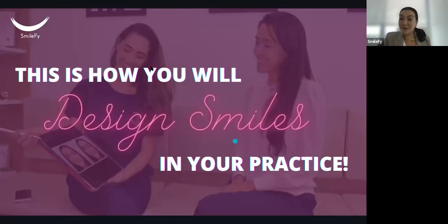So are you ready to get started with us? I want to show you how to get started. So today, now it's our hands-on. So I want to get started with pictures.